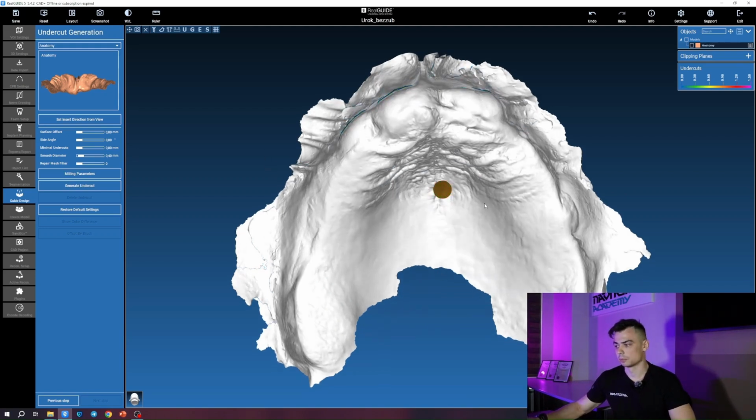Yes, one more important point. Of course, it's clear that in your clinic you might have, say, an intraoral scan, or for example, someone applies composite, places orthodontic screws, someone else makes holes in a plastic prosthesis and also applies composite to them, then scans. You can do it however you like, but I'll repeat, we do every case this way. That's the first point.